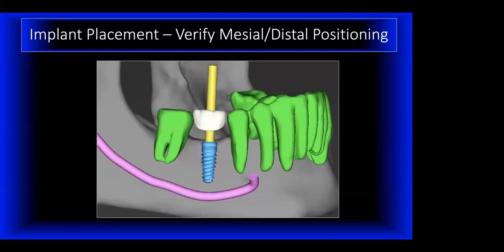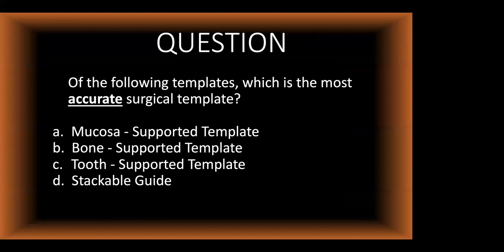So as I said, there are sometimes issues with the second molar when you're replacing the first molar with the mesial distal positioning. When you have a distal inclined second molar like this one, you don't go parallel just to the second bicuspid. You bisect the angle of the long axes of the second bicuspid and the second molar. So you can see that is more of a proper position. And that is basically the only tooth in the mouth that has that issue, mainly because of the very common distal inclination of that second molar.